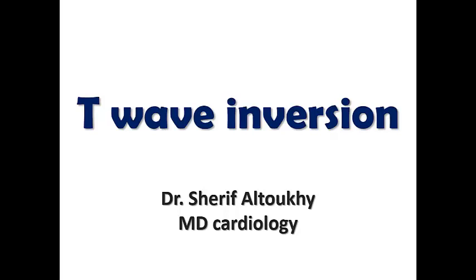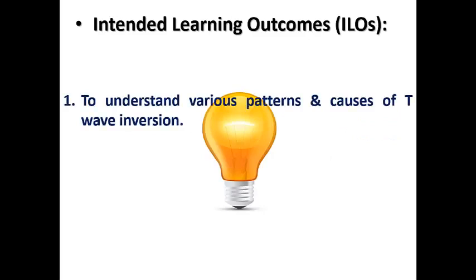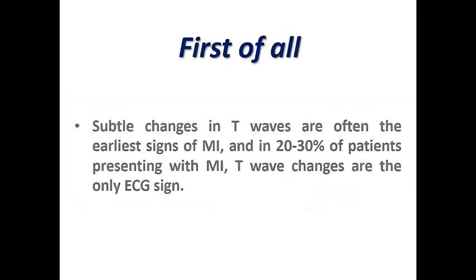After we have explained the ST segment elevation, ST segment depression and pathological Q waves, we are coming to the interesting topic and common situation in our clinical practice, T-wave inversion. We are going to learn today the various patterns and causes of T-wave inversion, plus the clinical significance of T-wave inversion in different clinical situations.